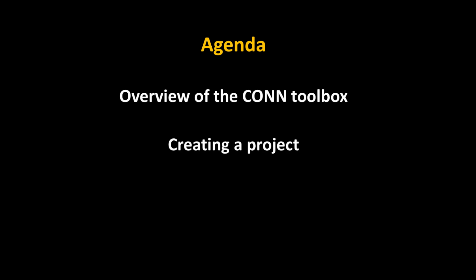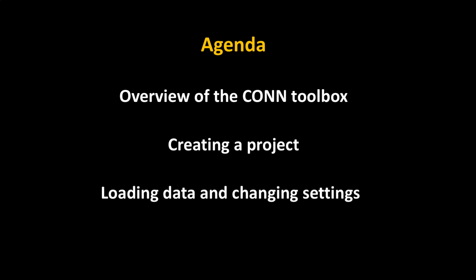We're going to actually create a project to do our pre-processing and denoising, and then load some data, this NYU data set, and I'll be guiding you through analyzing a single subject. It's not going to take that long. So we're going to do all the actual processing in real time. It may take 5-10 minutes tops, I would say, depending on how fast your machine is.